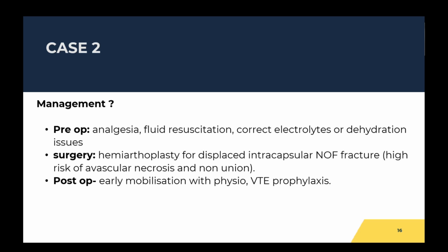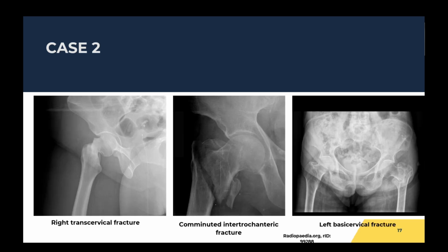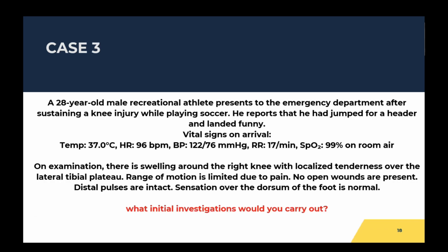Okay. And the next slide is just a couple of x-rays of different types of neck of femur fractures. Although it's just good to include that, it's probably good to have an idea of what each type looks like on an x-ray. Okay, and next is case 3.